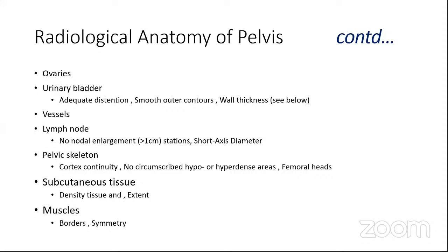Of course, the patient would have gone through diagnostic scans as well, and such scans would have already ruled out most of what we have seen now. But this is just a check screen, where we ensure that no other findings have been missed in any of the diagnostic scans. Sometimes there might be a time gap between the diagnostic scan and the planning scan taken at the time of planning. Such a time gap can introduce newer findings or newer abnormalities, which can be checked for very well.